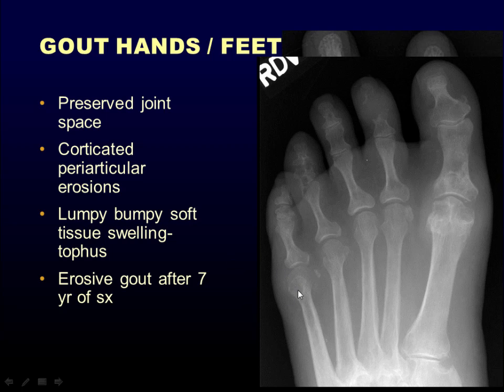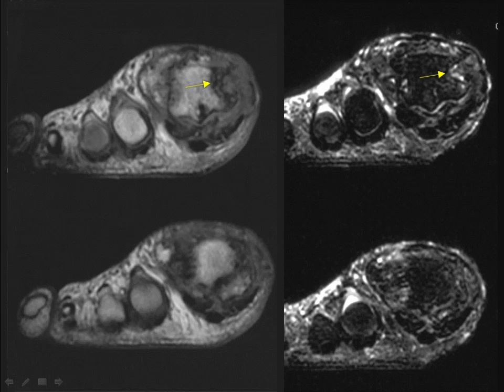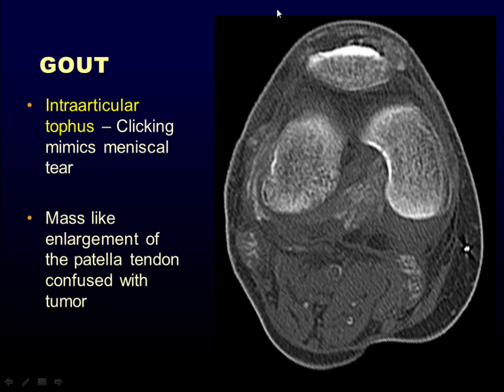Same thing at the fifth. I'll point down here that we have it at this first metatarsophalangeal joint as an erosion with the joint space preserved. Nice sclerotically marginated erosion, all classic for gout. Gout loves the midfoot. And what it looks like on MR is that gout deposits tend to be very black on these T2 sequences. We're used to going to T2 usually as our pathology sequence and seeing all the pathology as being bright, but don't expect that with deposition diseases like gout, where it's a very black substance creating an erosion in the adjacent first metatarsal head.